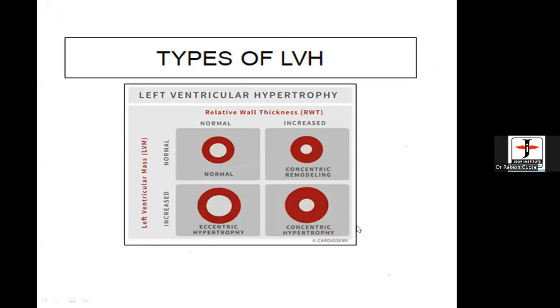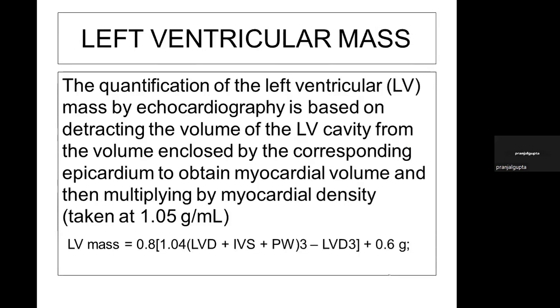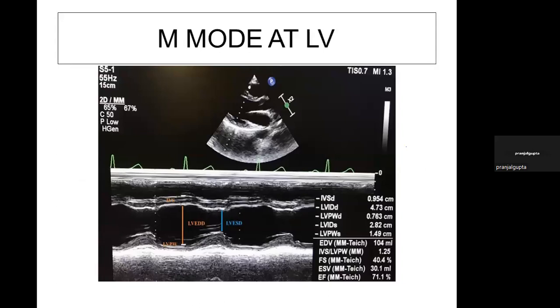Hello. Go ahead, Prakhar. Sir, I just want to know that when we measure the septal length or septal width, you can say, by M mode or by direct looking and calculating the septal thickness, then it comes different at different stages of M mode. So should we rely on direct measurement or should we rely on M mode?